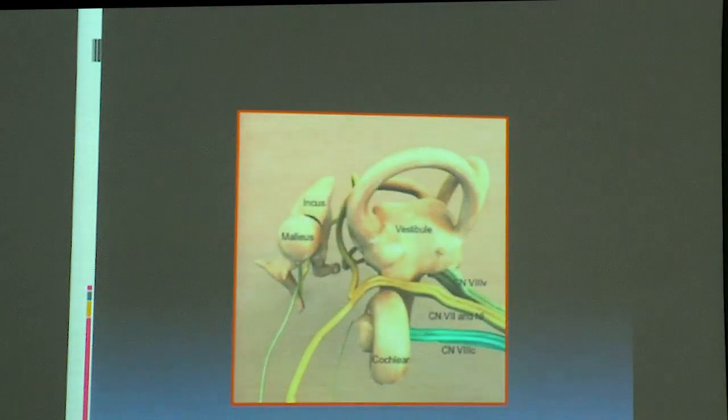are going to proceed. So if we cut the facial nerve far anteriorly, we are going to get the greater superficial petrosal nerve as a single dot. We cut it more posteriorly, we are going to get a wider dot which is going to be the geniculate ganglion. We cut it further posteriorly, we are going to get two dots side by side. So one will be the labyrinthine segment and the other will be the tympanic segment. So let's see.